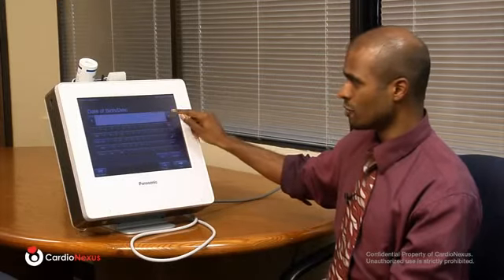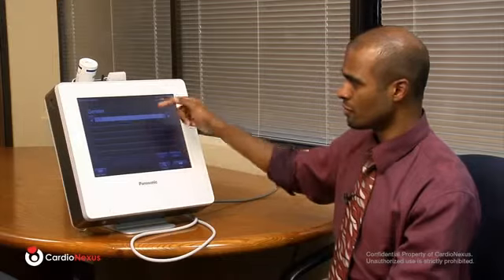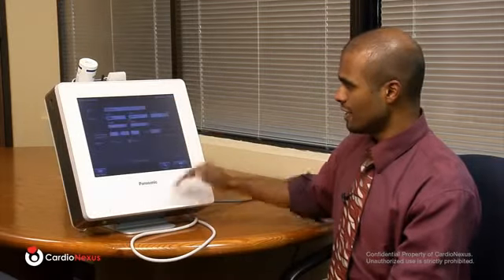But again, I will focus on the required information being subject ID, patient name, age, and gender. So typing in patient age, and lastly, I'm choosing a gender from the drop-down menu here. As soon as all of the required information has been entered, you can then press the next button to take you into the next page.